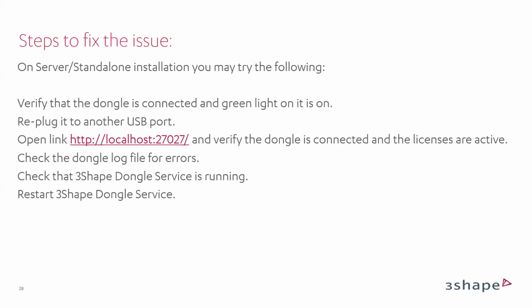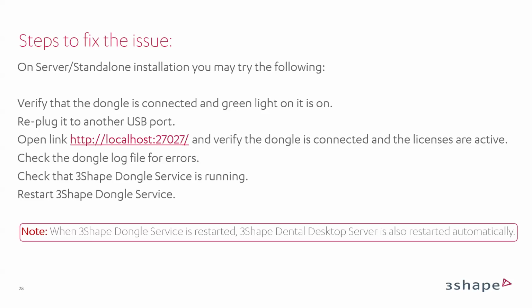Restart the 3Shape dongle service in the services. There is a note that when the 3Shape dongle service is restarted, the 3Shape Dental Desktop server is also restarted automatically. So actually, we can have this simultaneous restart process for the same services.